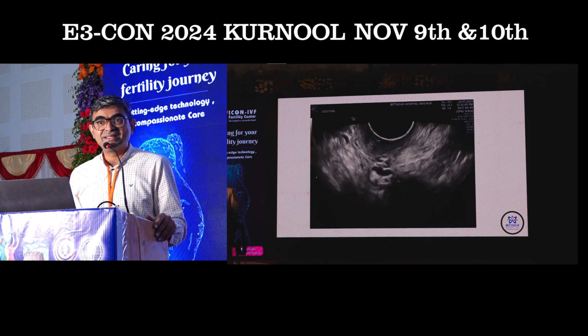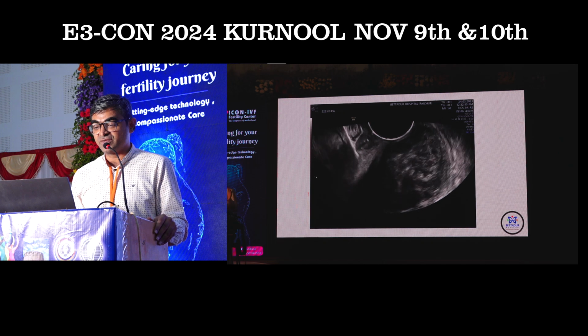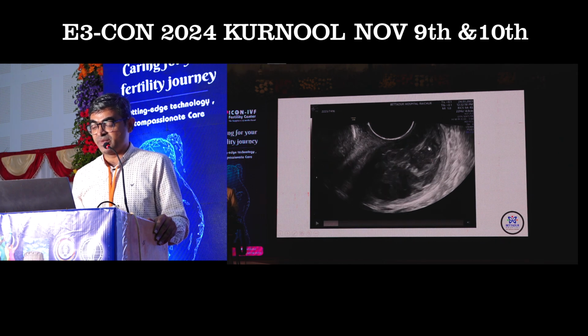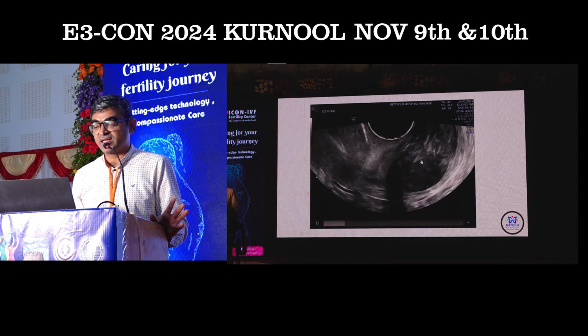So what is this lesion in the cervix? Hypoechoic lesion which is circumscribed in the posterior lip of cervix. This is the anterior lip actually, posterior lip of cervix, as what madam was describing today. It is appearing with classical edge shadows. So yes, it is a cervical fibroid. Yeah, this is a cervical fibroid.